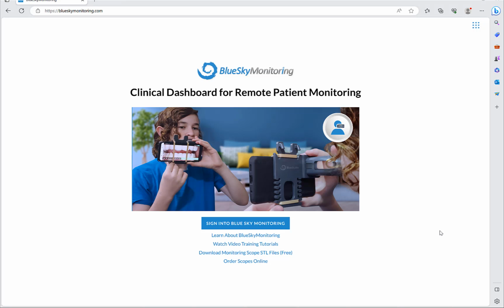We have added some new features and functionality to our new Blue Sky Monitoring platform. In this tutorial video, I will take you through the process of setting up a patient and creating the timeline, and I will point out the new features and functionality as we go along. If you're not yet familiar with Blue Sky Monitoring, then simply go to BlueSkyMonitoring.com and click on any of the links below to get to the relevant information page.